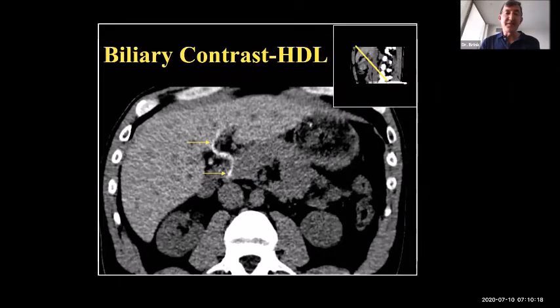But if there's one thing that I learned from doing this, it's the plane of the hepatoduodenal ligament, which you can see is the plane of reformation of this scan, which is showing the bile duct laid out on a single image. You can see that it's almost a 45-degree angle, which highlights the plane of the hepatoduodenal ligament connecting the porta hepatis of the liver to the retroperitoneum. This is the pathway by which much disease will spread up and down this ligament from adjacent cancers and other inflammatory conditions. We'll look at many cases like this, but keep in mind, this is the plane of the ligament, almost a 45-degree angle from porta hepatis to retroperitoneum.